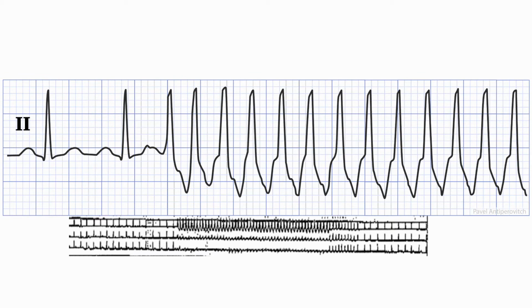The approach to any arrhythmia problem is to start with a general differential diagnosis and use observations to narrow this differential. So as for any wide complex tachycardia, the differential is VT, SVT with aberrancy, pre-excitation, pacing, and artifact. At this point we can rule out pacing because I don't see any pacing spikes, pacing artifact. This is a fairly clean tracing, so I don't think this is noise, but it always could be, I suppose.